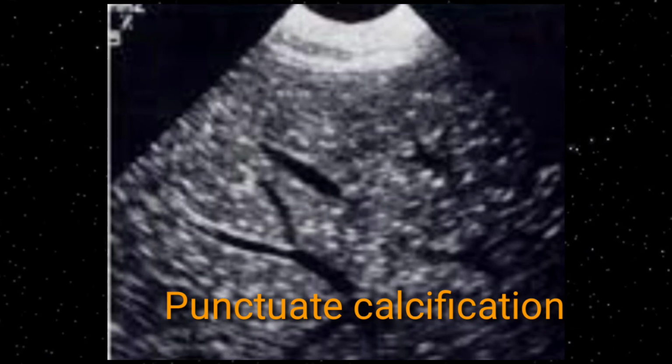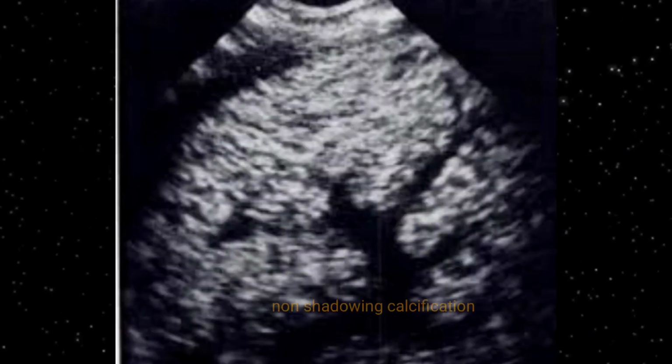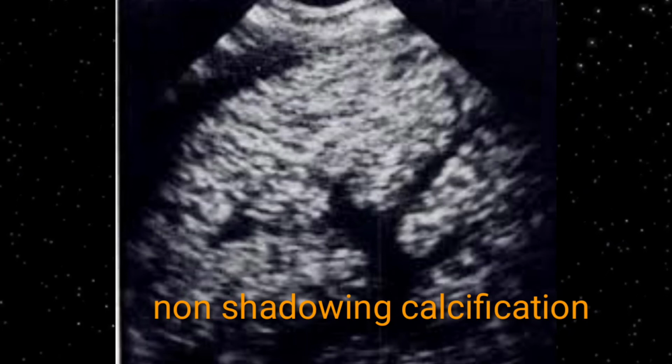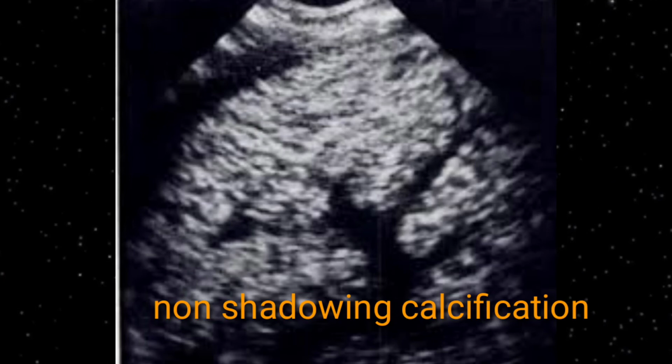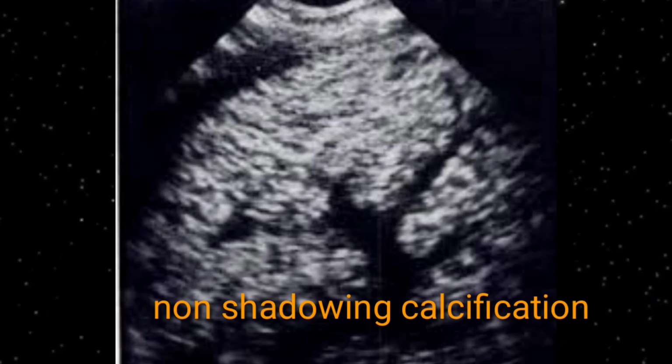Pneumocystis carinii is the opportunistic infection usually seen in AIDS patients. On ultrasound images, this liver shows multiple tiny diffuse non-shadowing echogenic foci, usually extensive and replacing all the liver parenchyma. This is another slide. Here you can see the liver parenchyma is replaced by multiple diffuse tiny non-shadowing echogenic foci. So this is the classical example of pneumocystis carinii, and this patient is suffering from AIDS.